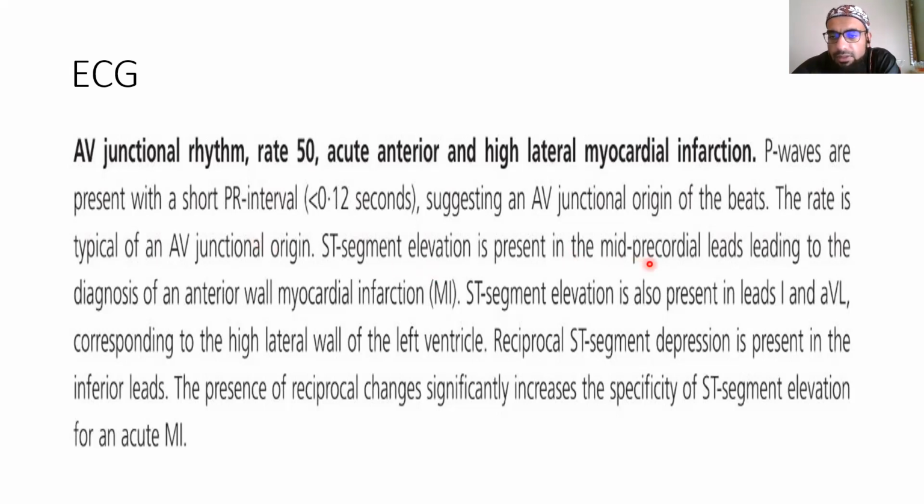ST segment elevation is present in mid-precordial leads, leading to the diagnosis of anterior wall infarct, V2, V3, V4. Remember, V2 is called anteroseptal. It looks at the septum and anterior.